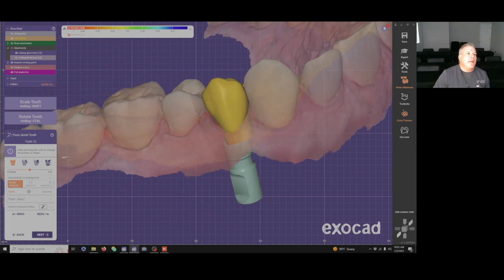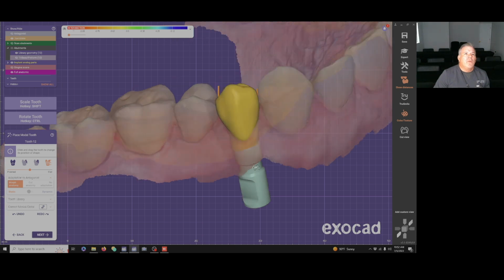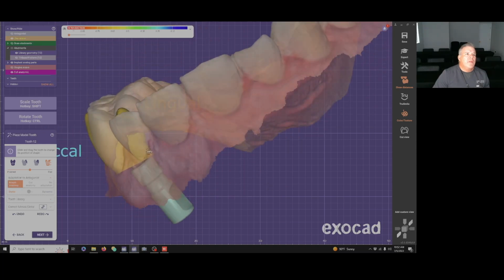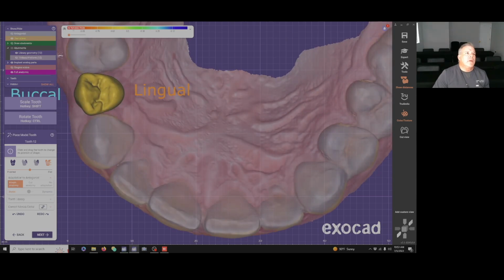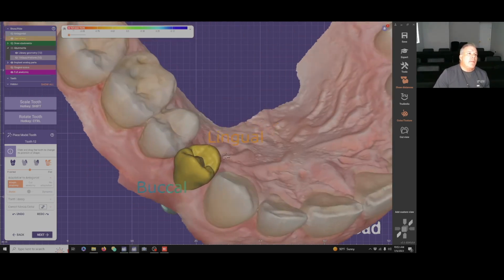So what I'm going to do is I'm going to click on this section here and just move parts and pieces of this. So I'm going to grab the middle and move it over. I'll grab the bottom and, oh, I need to go a little lower. There we go. Kind of move that over a little bit. I'm going to click on this and move that over also. Grab the middle there, move that in a little bit. That still matches, so it looks pretty good. Make this a little bit more solid. That's a decent spot. I'm gonna go ahead and hit next.